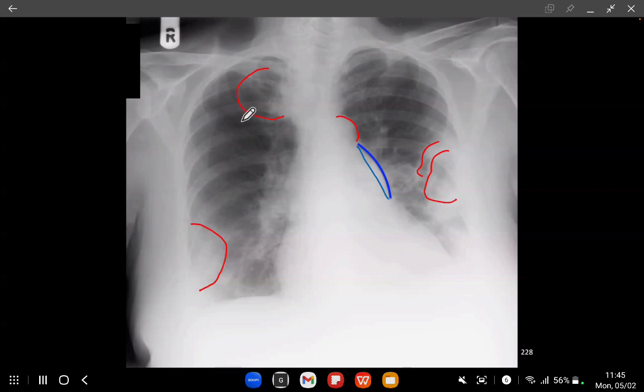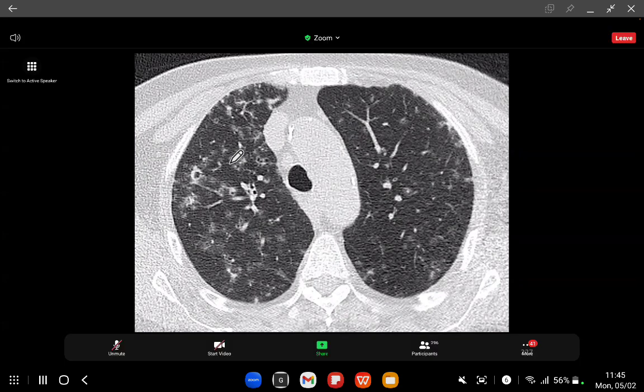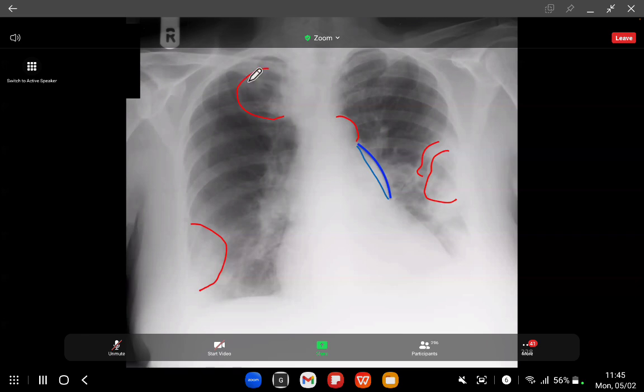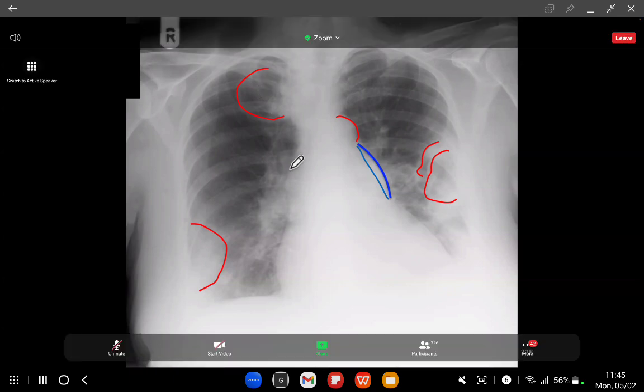So in the previous case, it was a differential diagnosis of about 5 or 6 things. But in this case, there isn't really a differential diagnosis because whatever's going on has caused pulmonary artery hypertension. And so the one diagnosis that fits everything is thromboembolic disease with cavitary infarction.